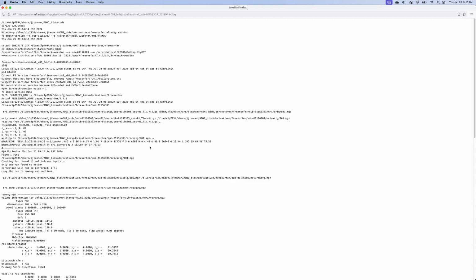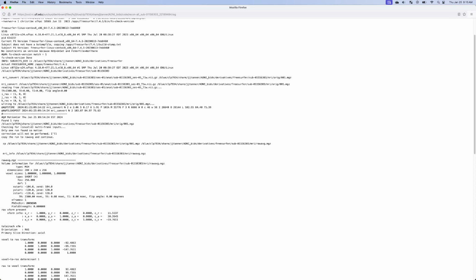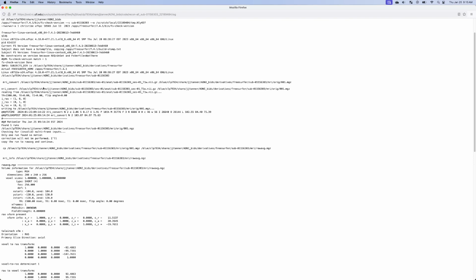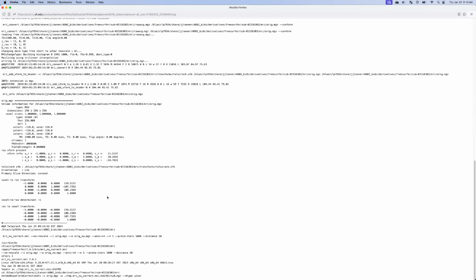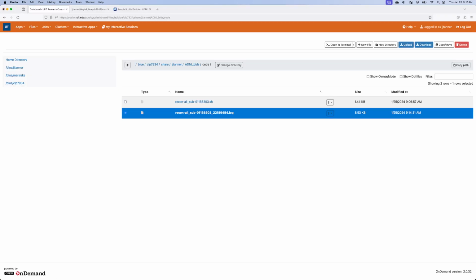Don't worry about what all of this means, but what you can look at is FreeSurfer. It's finding it. It imported this file and renames it into this MGZ format. MGZ is for Massachusetts General Hospital, which is where the FreeSurfer team is housed and where it's primarily being developed. So it read the file, converted it, and is doing a lot of processing. That's what we expect. It's working. It was able to find the file and everything, so it should be good.